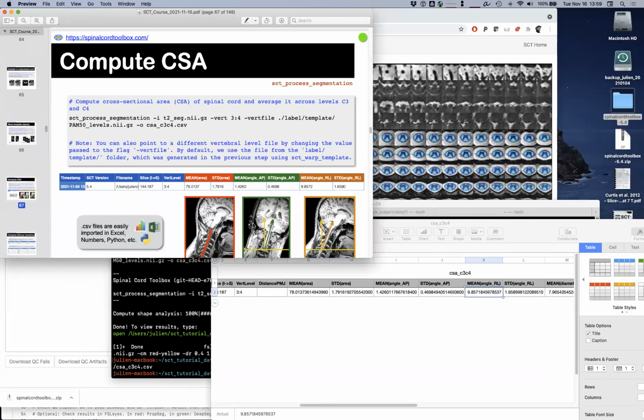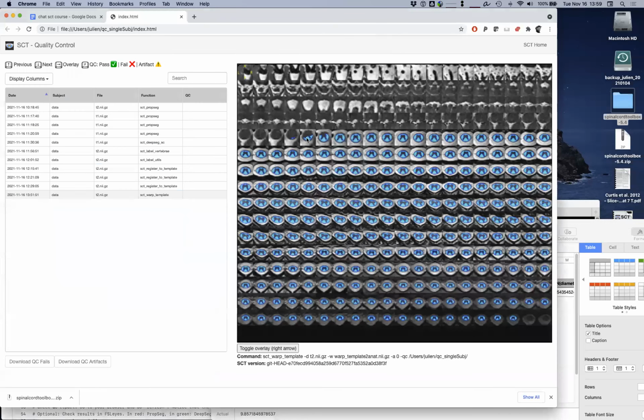Right. It will actually include anything that has a segmentation. So in case on the edge we have a partial segmentation, yes, it will show you a value that is abnormal, right? So there are various ways you can deal with that. The median will still be biased. It will be less biased than the mean, but it will still be biased.